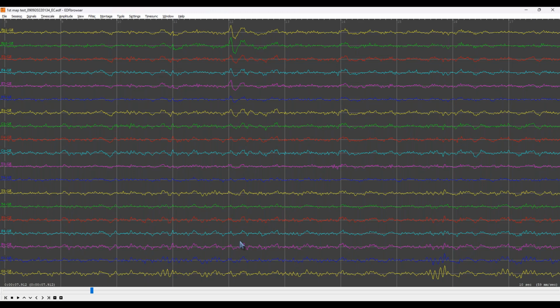neck muscles. So, again, like we talked about on Wednesday, if you get somebody with neck problems, whether that's just really tight muscles, or maybe they should be seeing a chiropractor more often, they've got subluxations in the cervical vertebrae that are in turn putting tension on those muscles, then we would see that showing up down here.